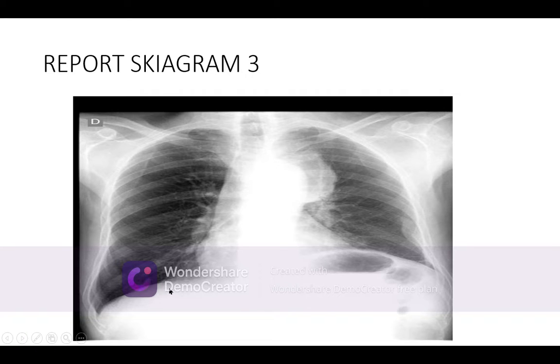Soft tissue shadows: here you see the dome of the diaphragm on the left side and the right side, and on the lateral wall and above it you can see the neck area with soft tissue shadows, and this part is a soft tissue shadow also. Here it is, this part, the superior mediastinum. This is a soft tissue shadow. It is a shadow, yes, definitely. And this is a shadow, a soft tissue shadow.